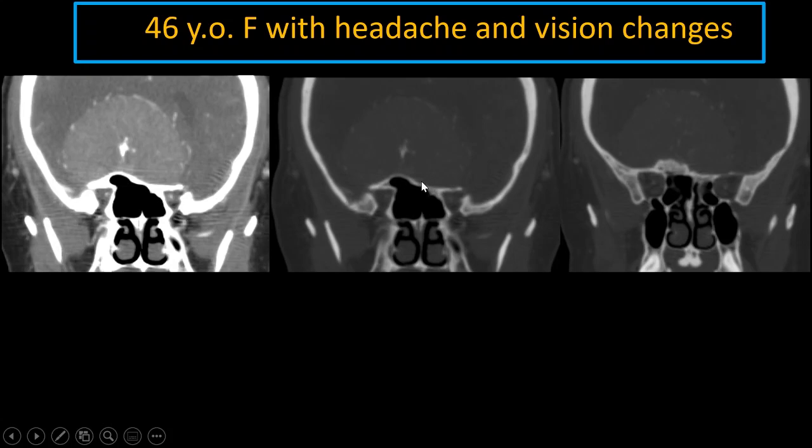We can see that there's ipsilateral expansion of the right aspect of the sphenoid sinus, as well as overlying hyperostosis. And this is a nice example of a meningioma with associated pneumosinus dilatans, referring to this increased pneumatization or expansion of the sphenoid sinus, and has associated hyperostosis, a common finding seen associated with meningiomas.